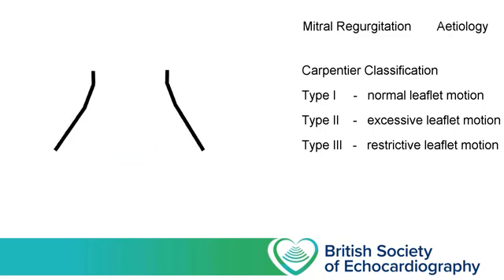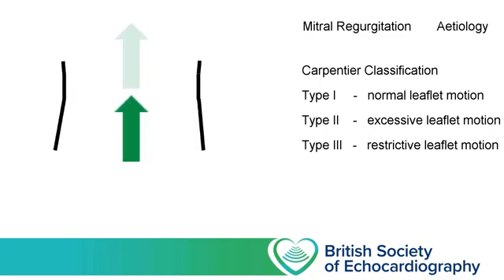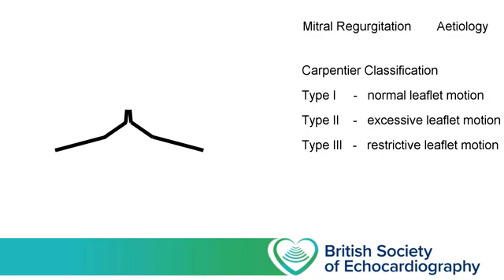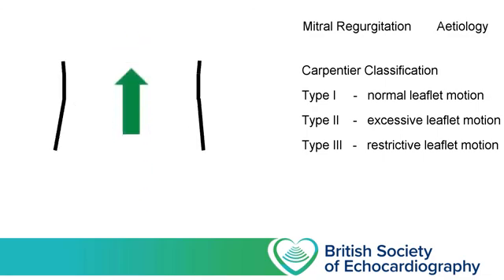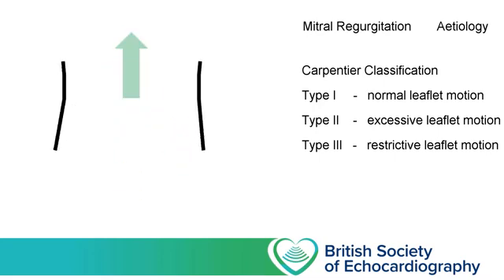but before we do, let's consider what sort of jet we might expect to see if we had an isolated lesion of a single leaflet demonstrating abnormal motion. So if we take a look at this graphic, if we imagine that the left-hand leaflet is completely normal and the right-hand leaflet has restricted closing during systole, here we can see that the MR is directed underneath the abnormal leaflet.